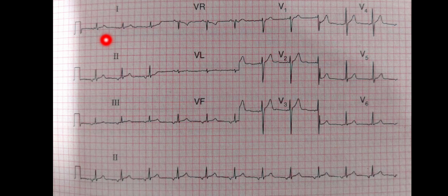Then we start looking at the PR interval, QRS complexes, ST segment and the T wave or any abnormal wave in all the leads. So here these are normal in lead 1, lead 2, lead 3 and lead aVR, lead aVL. Here you can see an upward P wave in aVR, which is not usually the case. Okay, and then we have the normal things in the aVL, and aVF is normal.